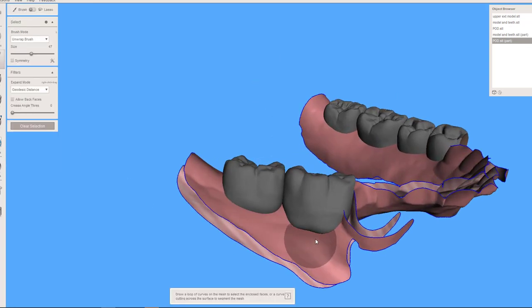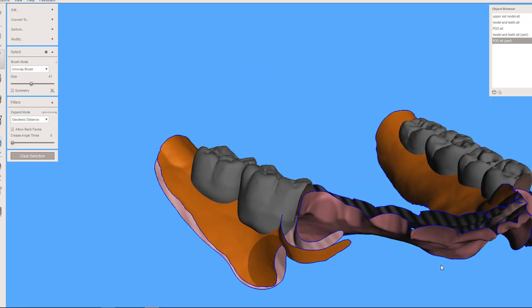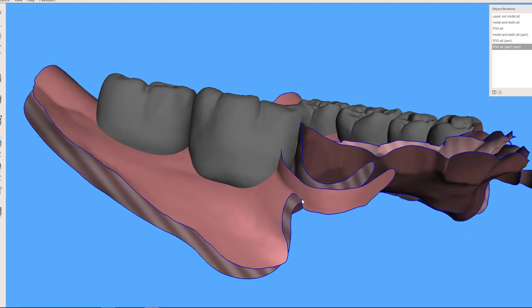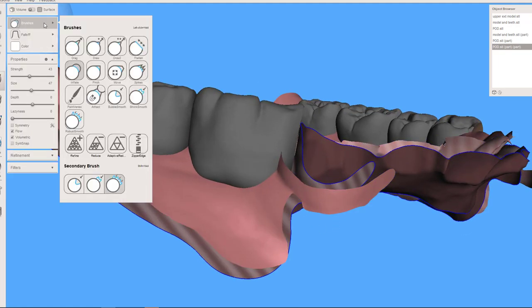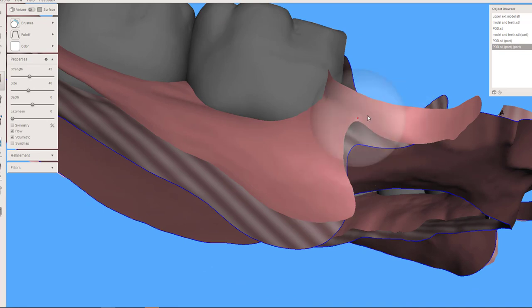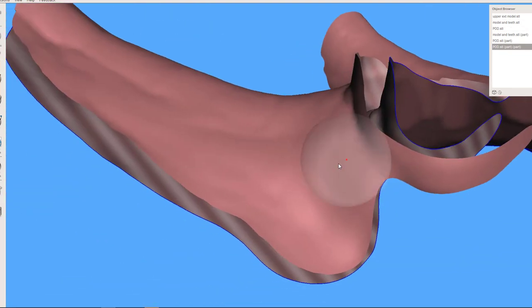Instead, what I want to do is click this mesh, because right now there are two meshes in one STL. I'm going to click E to expand to all the connected, which doesn't select the inside, and Y. So now this is its own mesh. I can work on this one all that I want without worry of distorting the tissue intaglio fit. So some of the things I would do is in offsetting, you're going to get some weird contours like that. So I might come in and use some smooth tools and smooth those up. I'll hide the teeth right now.